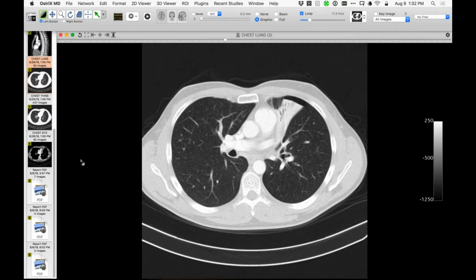I have heard it used in that context too. I think that confuses the concept. I don't think that's the same mechanism at all as what Woodring described and what Howard is showing here. So I don't think that's appropriate. The problem in those conditions of trapped lung is that the lung can't re-expand, and when you take away the liquid, you're going to leave behind gas.